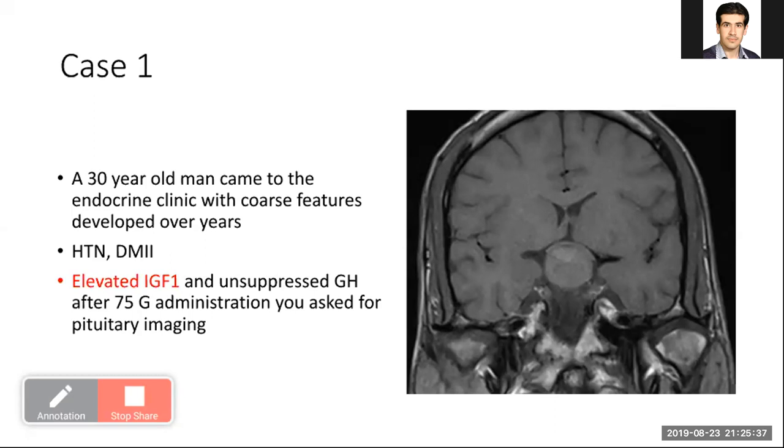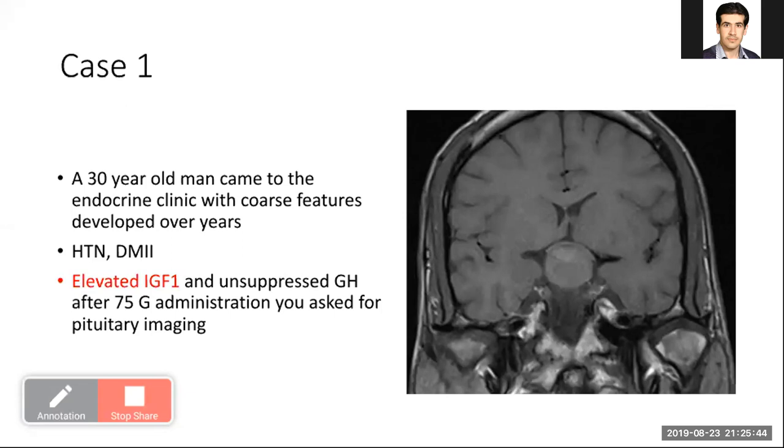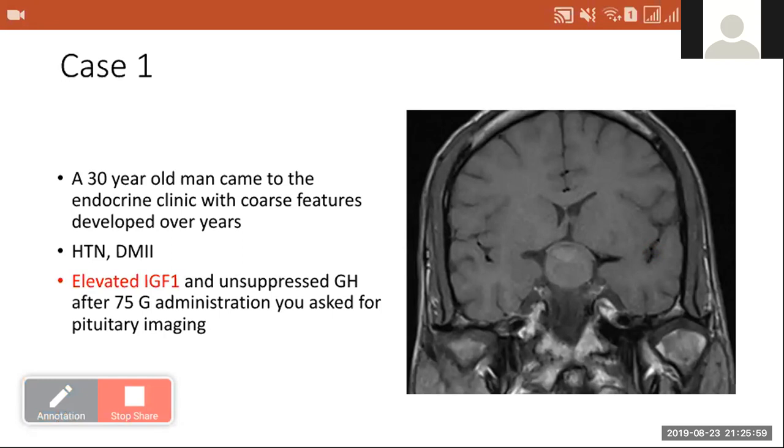Do you hear me? Yes, I can hear you with the image. Yes, this is the coronal image. We can see. Dr. Ibrahim, we want an interactive discussion. Yes, okay. Some colleagues, comment please. This is supra. Okay. Yes, Dr. Hassan. Okay.